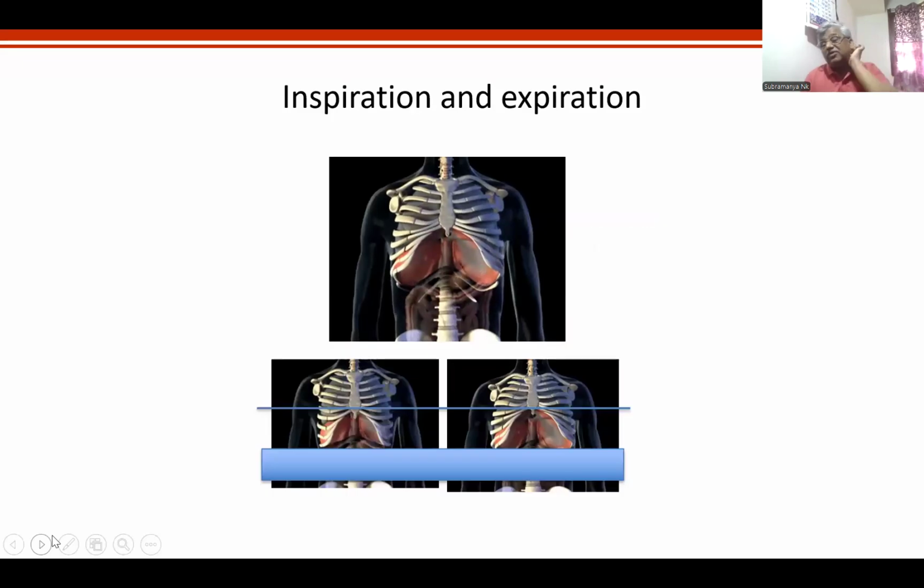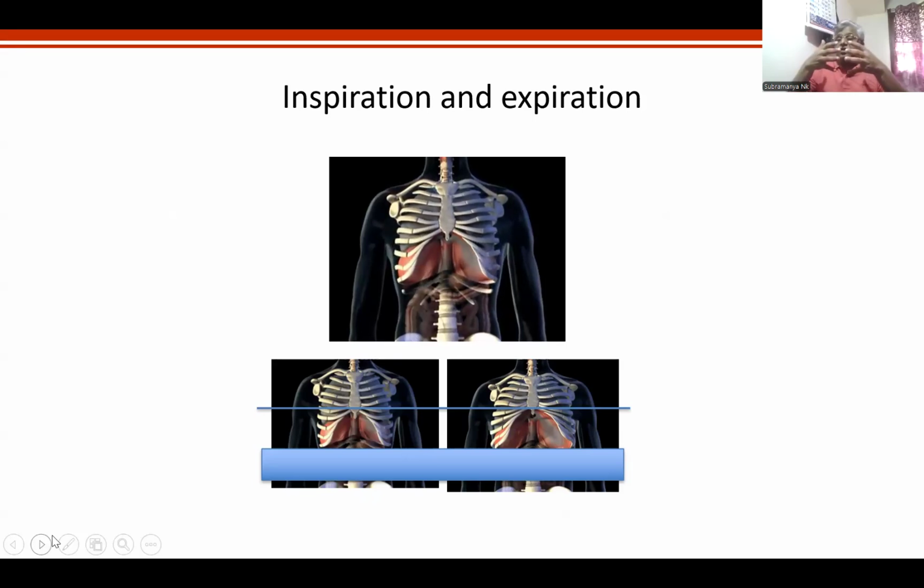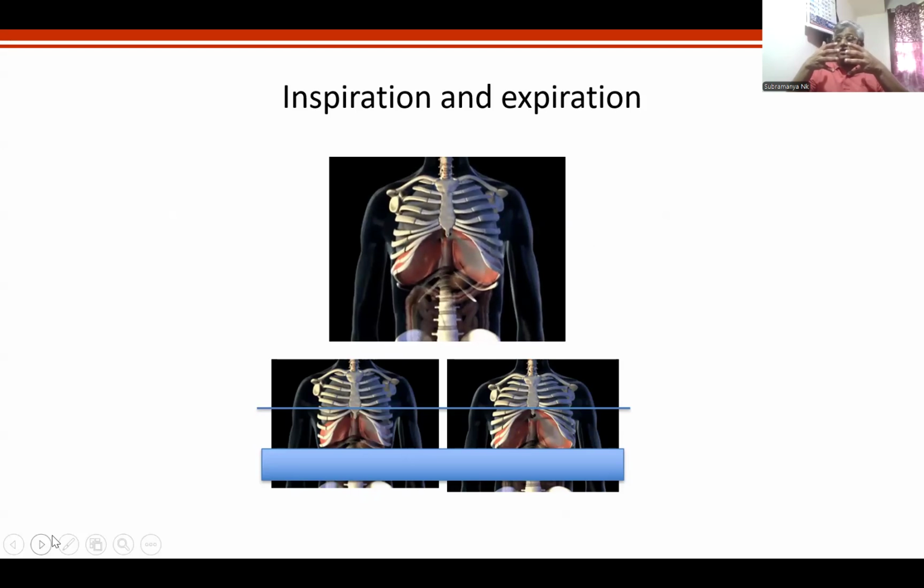Now, I want you to consider inspiration and expiration. Now look at this X-ray. Look at this image, which is showing inspiration and expiration. What is it that you are seeing here? Inspiration does not just mean expansion. Look at my ribs, my hands. These are the ribs. What I was thinking for many years is that inspiration means expansion. It is wrong. I will now show you what is inspiration.